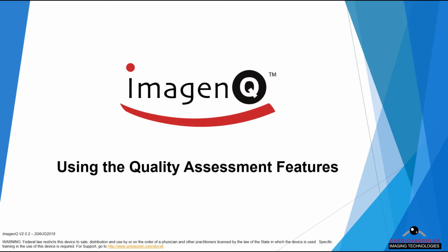My name is Dr. James Case, and I'm the Chief Scientific Officer at CVIT. This educational video will review how to use the quality assessment features of the ImagenQ and ImagenQ MD software packages.